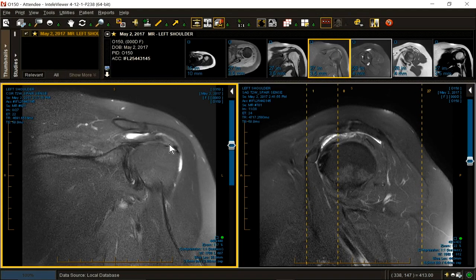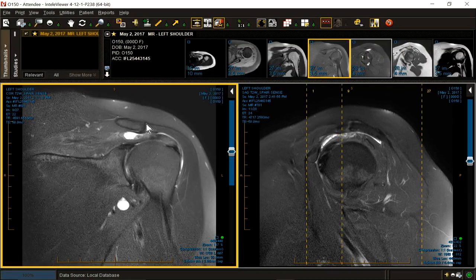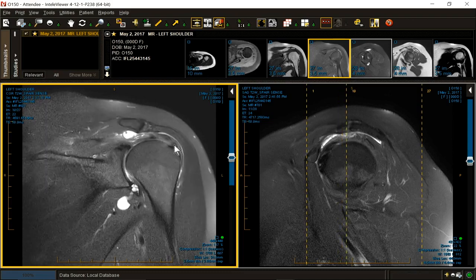So how would I start describing it? Tendon fiber failure. Where are my intrasubstance fibrils? Where is this? I want to see parallel fibers in my tendon. I don't. So that's a nice way of dismissing what is a very sick tendon. Intrasubstance, confluent tendinopathy, and/or footprint tendon fiber failure. We still have to figure out what's going on here.